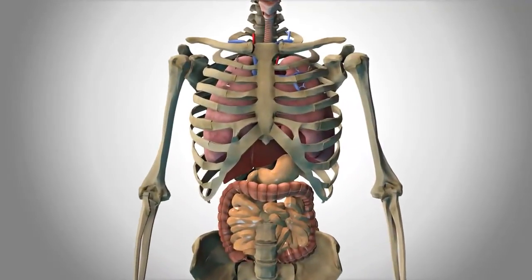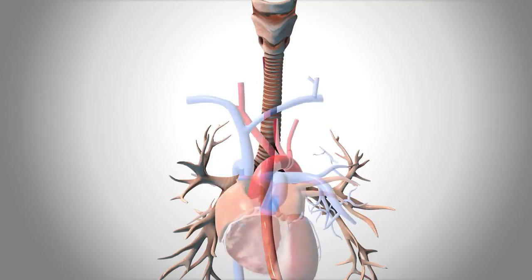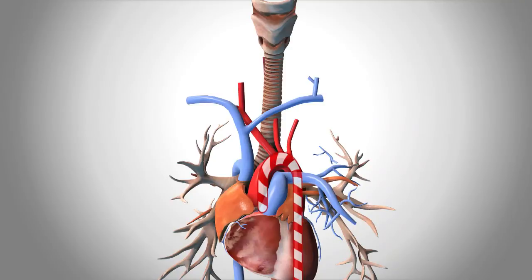Thus, when we look at the mediastinum, we want to use the vertical structures as a kind of rubric. A lambda for the airway, the trachea and main bronchi, the esophagus or the food tube, and the two candy canes, a blue candy cane for the azygous vein and arch, and a red candy cane for the thoracic aorta.